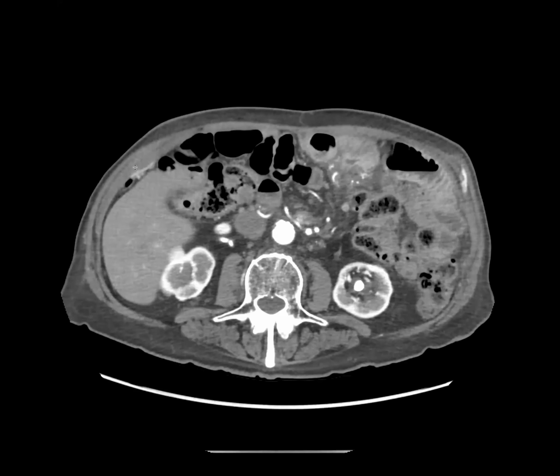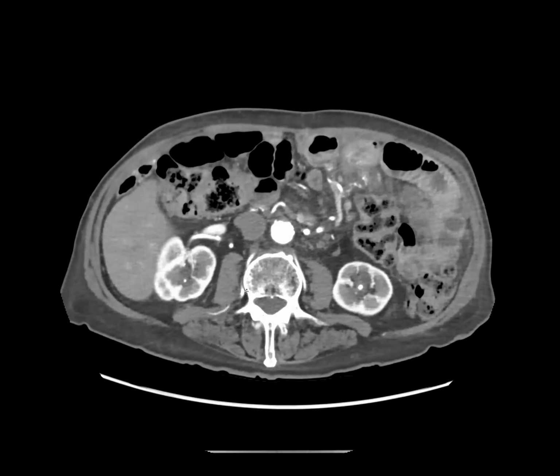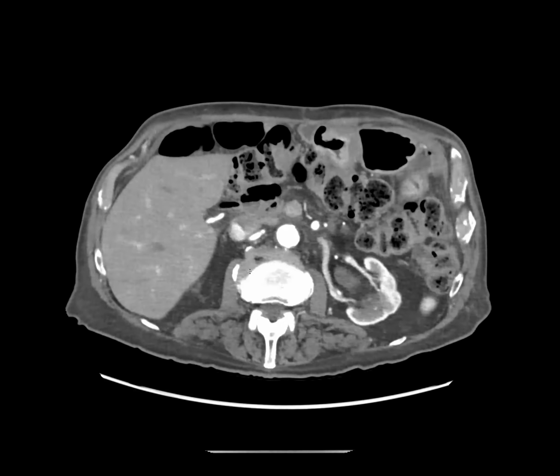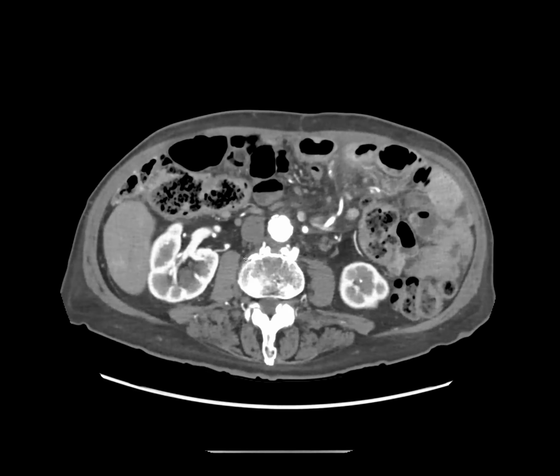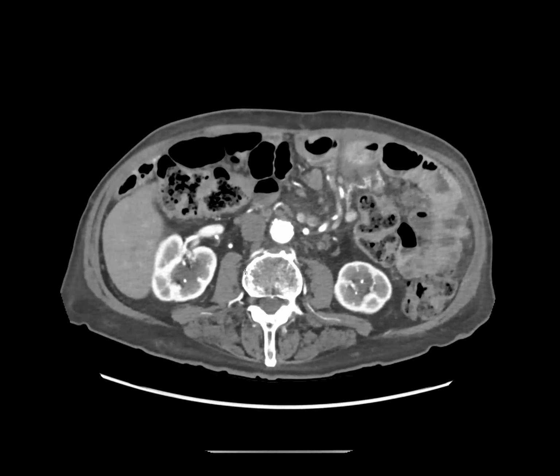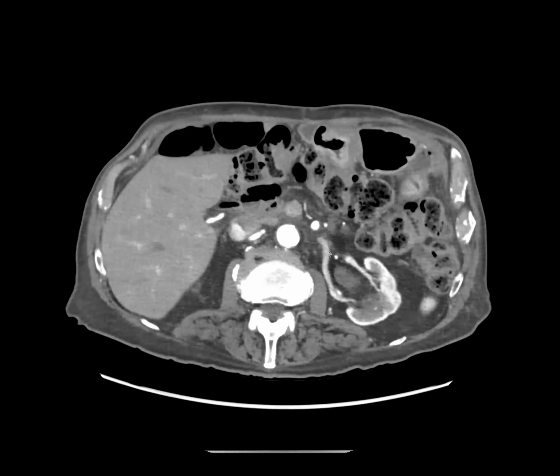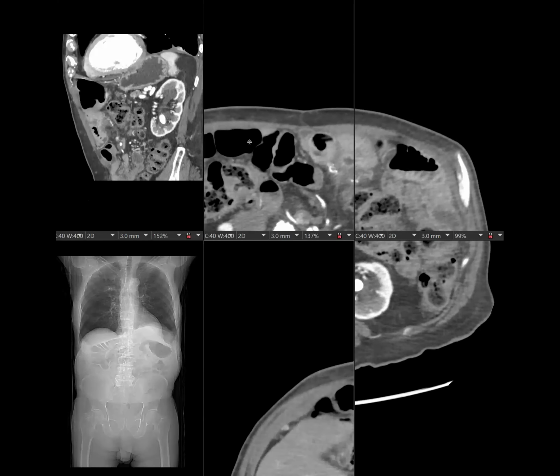This is a patient who had pancreatic cancer and a Whipple, and I'm showing you surveillance imaging, not for oncologic findings, but for complications that we can see from the Roux-en-Y. So here is the stomach. I see a lot of thickening at the gastrojejunostomy with maybe an ulcer. Is there a marginal ulcer right there?